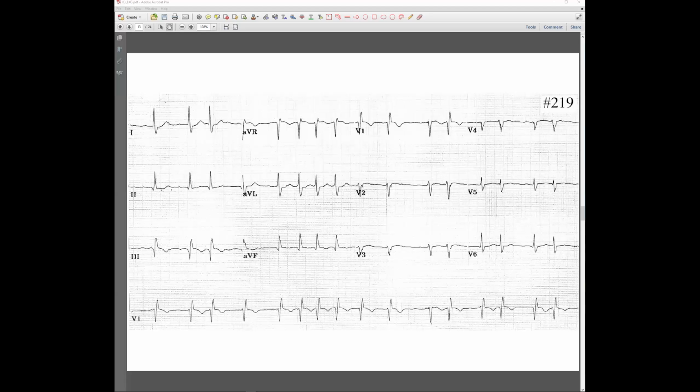Okay, good. Wow, that's a nice ECG. I like this ECG. Can you use your cursor? If you do have a pencil, you can use it. I'm going to hand it over to you. I have to find you. Lily, yes, I got you.